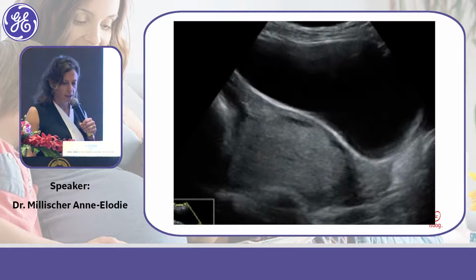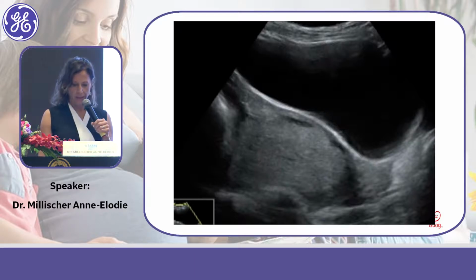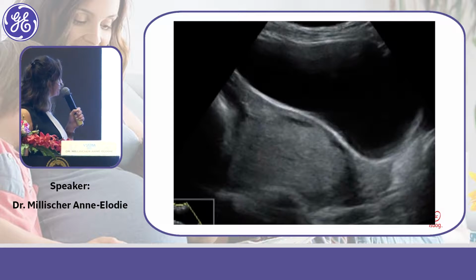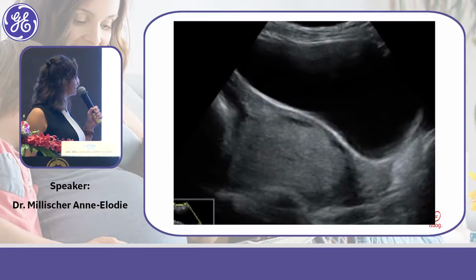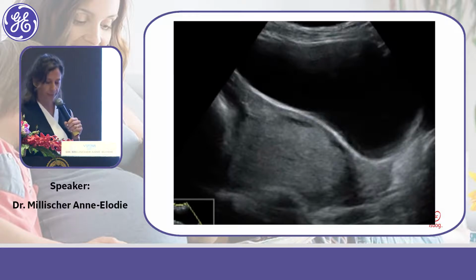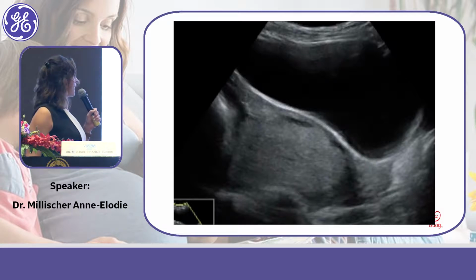And the last point will be bladder wall abnormalities. Và cái đặc điểm cuối cùng là bất thường cái thành bàng quang. With this hypertrophy of vessels in the interface between placenta and bladder. Mình mất đi cái interface, cái giao diện giữa cái tử cung và cái bàng quang. You could have this aspect within percreta. Các bạn có thể được cái hình ảnh như vậy ở trong cái thể percreta.